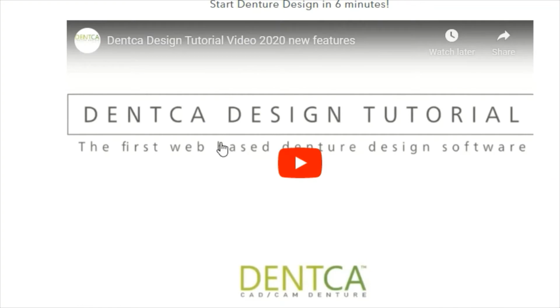For your convenience, I'm going to play the DENTCA Design tutorial video at the moment, so you can see all the great features that you can take advantage of by using the DENTCA Design service.